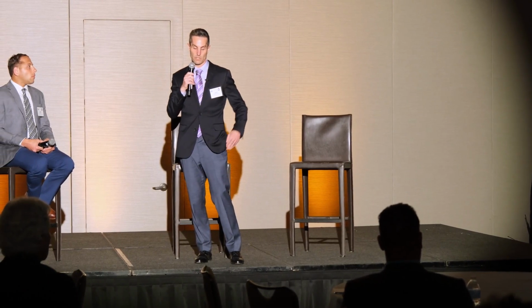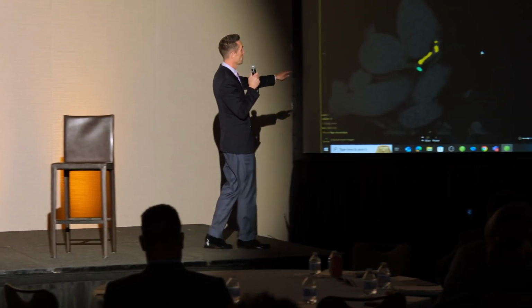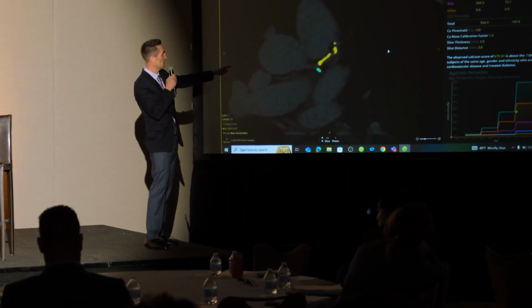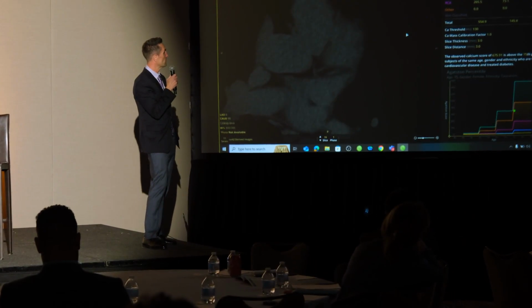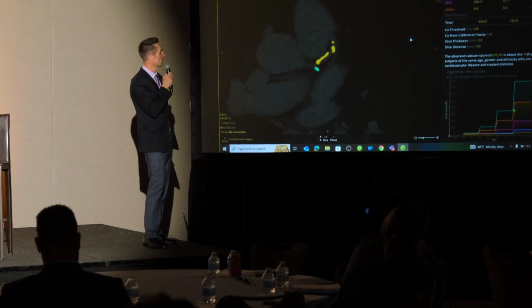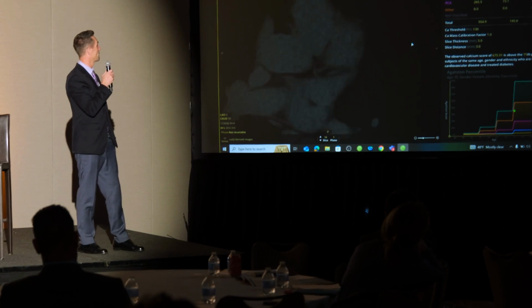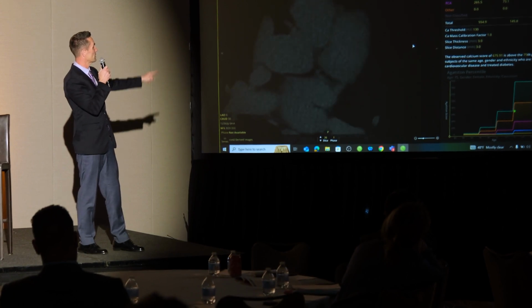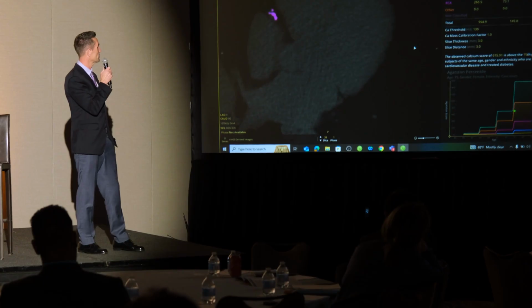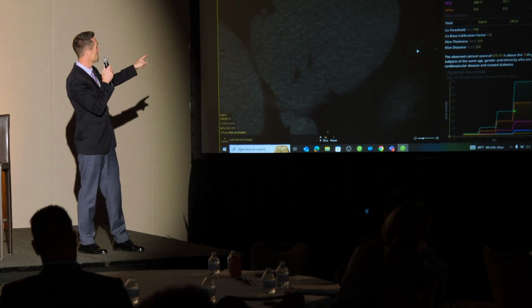And why don't you go down and just show, Patrick, the difference that we see, how nicely it correlates. So you have the left main coming off, and then the yellow is all in the LAD, and it nicely tracks it all throughout the vessel, as well as what looks like a little bit of a trifurcation, and then down through the RCA.